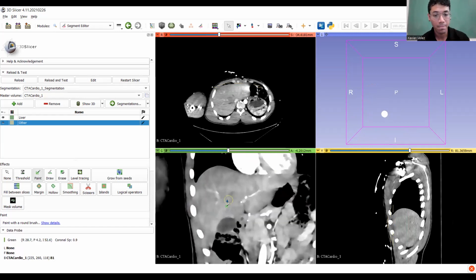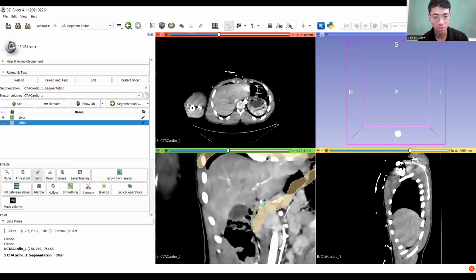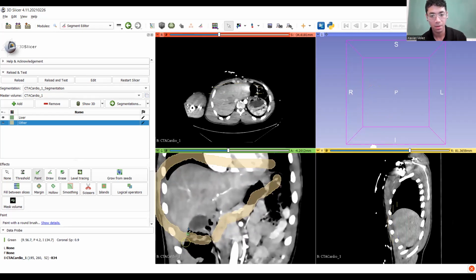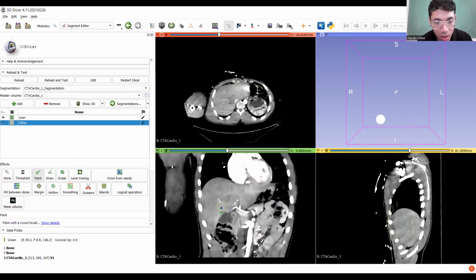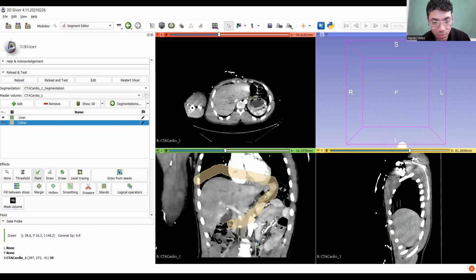So again, going to skip around a little bit, just get as much as I can. Sweet. Okay, we should be getting close to the edge. That's probably fine.